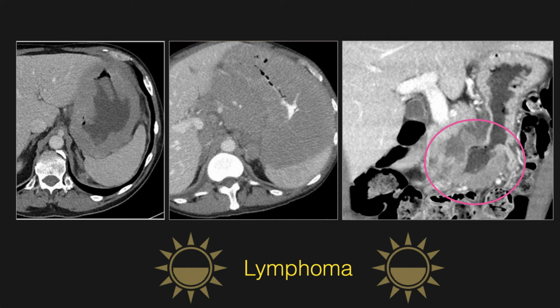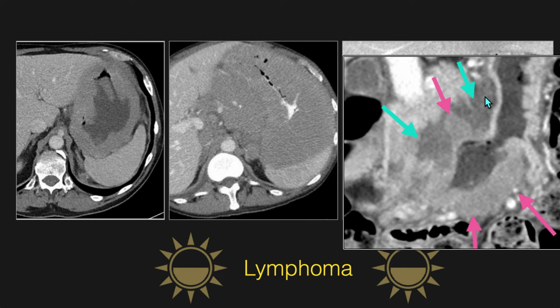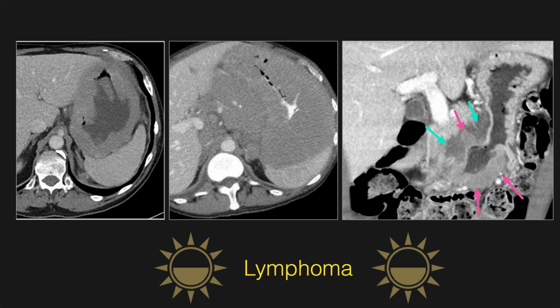This third example is a bit tougher to sort out as there's both tumor and ulceration. You can start to distinguish the two by noticing the edema along the upper margin flanking some soft tissue and a larger component of soft tissue or lymphomatous infiltration along the lower margin. This combination of edema related to inflammation and adjacent soft tissue helps to highlight the difference in density and how that helps us to make the diagnosis.